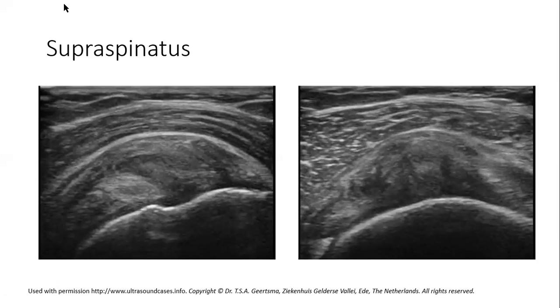So Ganesh is saying there's evidence suggestive of... No, this is not a full thickness tear, Ganesh. This is tendinosis. Okay, give it a try, Vicky. Do you say heterogeneous? Is that the way you pronounce it? Okay, there's hypoechoic, heterogeneous echotexture of the supraspinatus with thickening indicative of tendinosis.